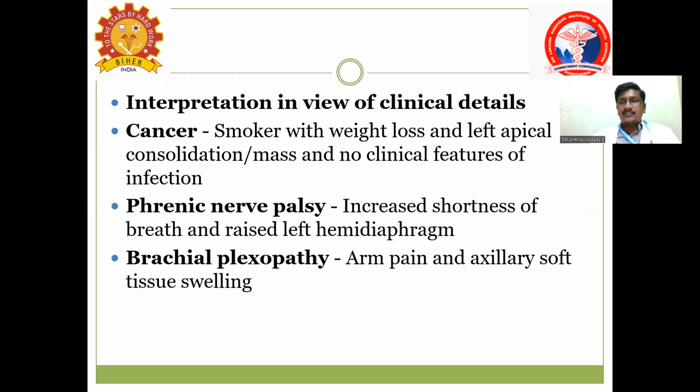Then technical aspects, the mnemonic RIP, and how it helps in identifying whether any technical fault is there or not. Then systematic approach, from central to periphery, how to see. Then the radiographic anatomy, the thoracic compartment, what the two lateral compartments have, and the central compartment, and the silhouette sign.